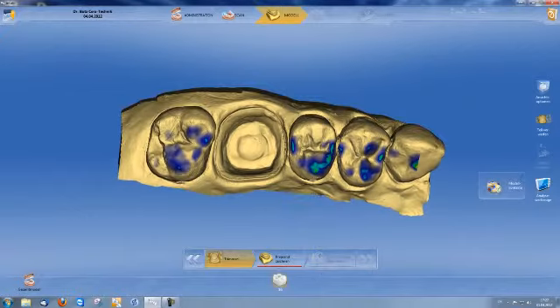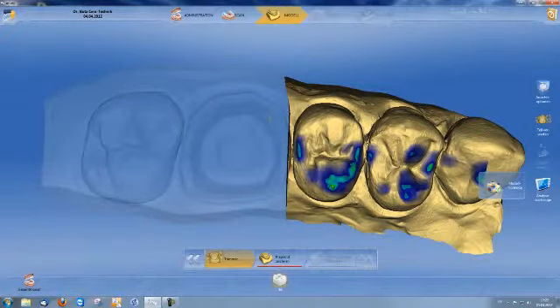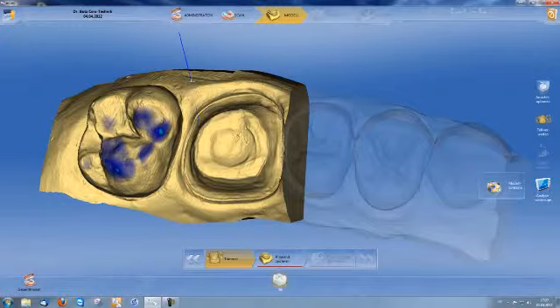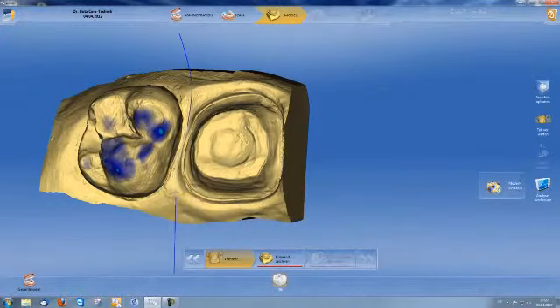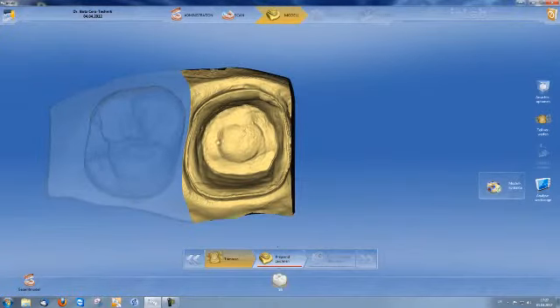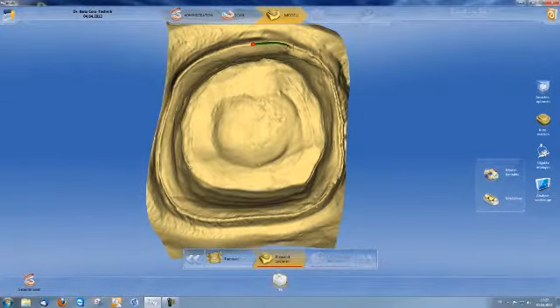and am taken to the model mode where I can hide the adjacent teeth. If the wrong area is hidden, do a double-click, and this is then shown. Double-click to start, click once to fix, double-click to end. Draw the preparation margin. Double-click to start the automatic preparation margin finder.